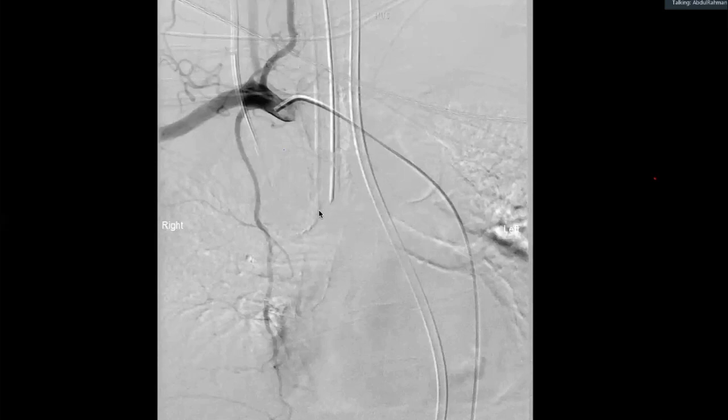Remember, on a DSA study, have a look at the non-vascular landmarks that may help you. You can see the trachea here. You can see the bifurcation into the left and right main bronchus. So almost certainly we're not in celiac artery territory. And the bleed is in the anterior abdominal wall. The celiac artery does not supply the anterior abdominal wall. Yes, sir, because we had just viewed the abdomen, that's how our brain works in the viva. Fair enough, that's fine.